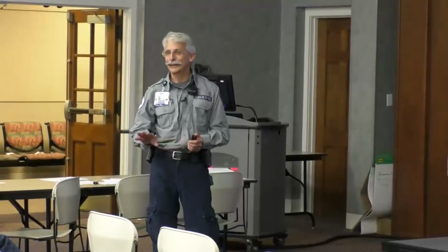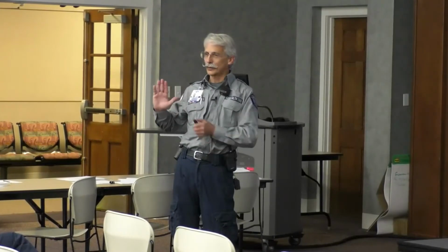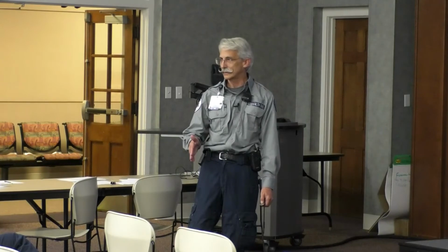No, when you're looking at a 12 lead, this is one big long lead there. That's why whenever it has the fourth one going across the bottom, you'll see that it coordinates with every one of those. Just looking at the time across there, I can look at that.